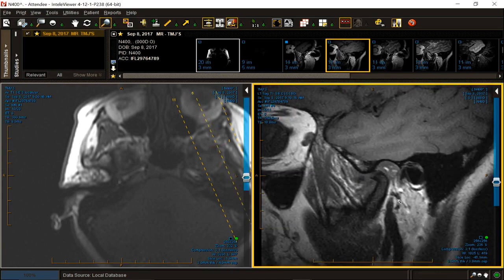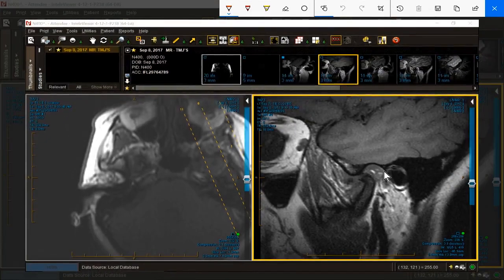Where's our meniscus? Our meniscus is all the way out in West Australia in Perth. It should be over here, right? And where is its connection to the attachments or to the rest of the meniscus, which should look like a bow tie? There's no bow tie. There's half a bow tie. So we have a ruptured meniscus on the left. We have detachment from its attachments, and we have arthritis with an open position or an open lock position of the condyle.